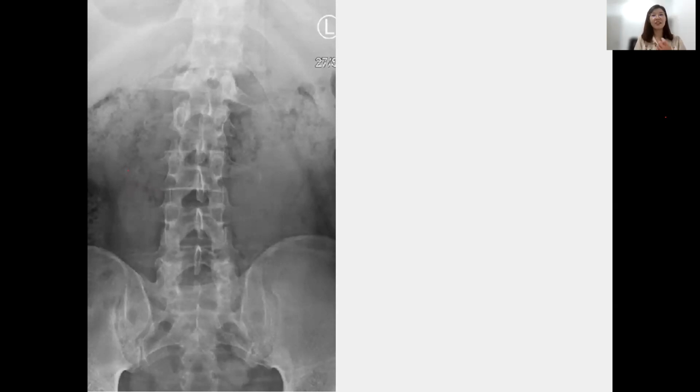If you sit further back, then you can see. So, review area. This one I already coned the X-ray, easy target. Lee said SBO, small bowel obstruction. No. With small bowel obstruction, you will see dilated bowel loops at the center, but there are none here. Okay, anyone else?